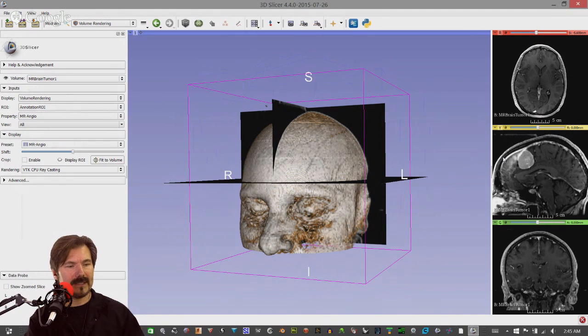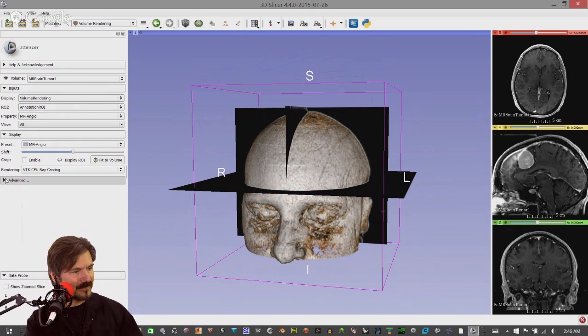In fact, one of the things that I identified is if you look at the images off to the right-hand side here, the bone is actually this dark space. Unlike CTs, which seem to illuminate the bone because of the reflection, MRIs just go right through it and is absorbed and shown in the actual soft tissues or tissues where you get all your highlighting. So we would actually have to inverse this. So we're not going to use this for the strength of doing bone. We'll have another one to work with, but we want to look at some of the tissue.